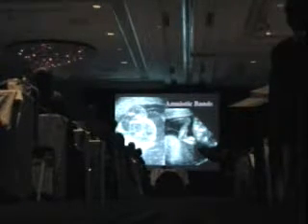Here's a fetus with amniotic band syndrome, and you can see that, first of all, these amniotic bands are coming right into the head. This is a coronal view of the head, and here is an encephalocele. But this encephalocele is asymmetrical. It's sort of coming off to one side, in a sense. And that doesn't make embryologic sense, if you will. And the things that don't make embryologic sense, you can think about amniotic bands.